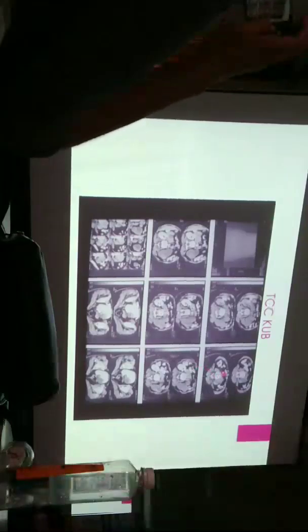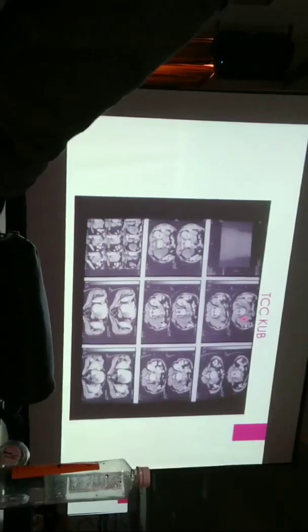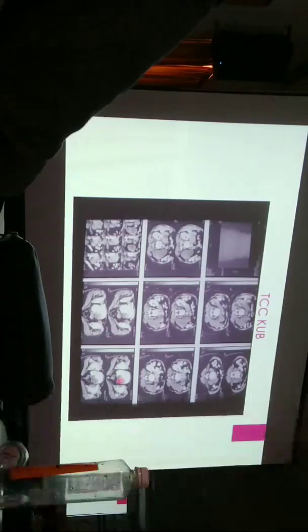So to differentiate, and sometimes there may be a difficulty to differentiate whether it's an RCC or TCC if it is centrally located. Transitional cell carcinoma occurs in the renal pelvis. They have a centrifugal extension in contrast to RCCs, which extend from the cortex to the renal pelvis, a centripetal extension. This is a CT image that shows a soft tissue density lesion in the renal pelvis. This may be multifocal, and commonly another lesion is seen involving the bladder as well.